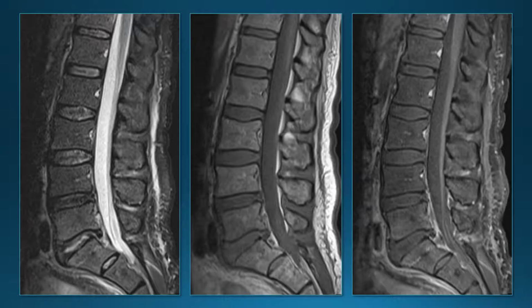As I said, he also had a lumbar MRI when he initially came in, and we can see T2, STIR on the left, T1 pre-contrast and T1 post-contrast. It was not too remarkable. The L5-S1 disc does have a little bit of bright signal in it, but we weren't too concerned about it. No enhancement. So we just had some degenerative disc disease at L5-S1 and not much else.